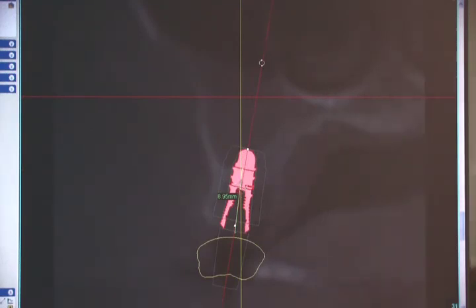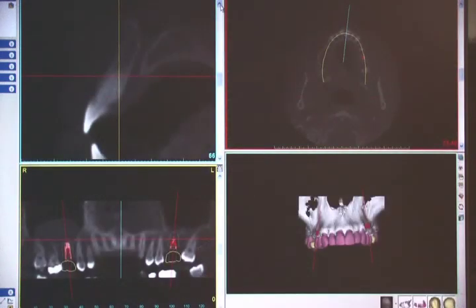Okay, so now you're definitely making more of a jump. So I guess the question I have for you would be: would you either stay with the 9 and do a little bit of a bump, or getting a little more invasive when you have to go into a little bit longer implant? Knowing that we do have some pathology in that area, the decision was made to put a 9 millimeter implant in.